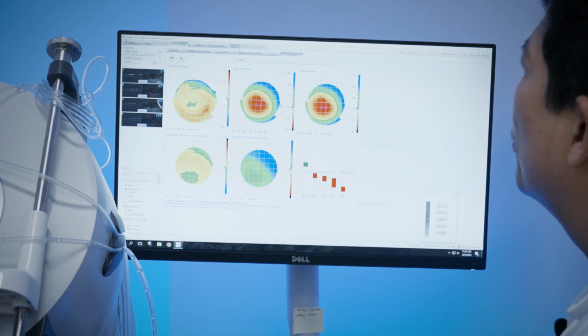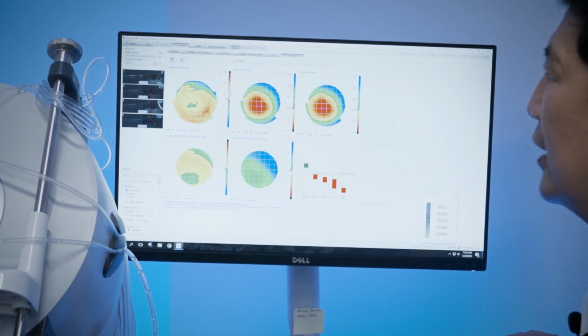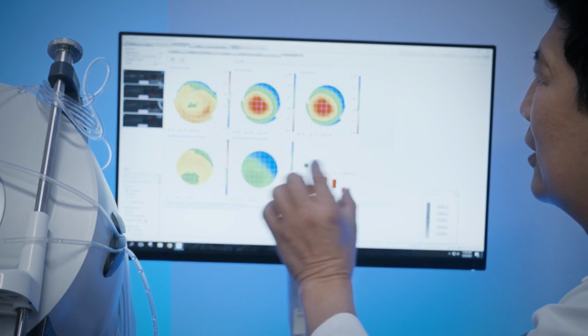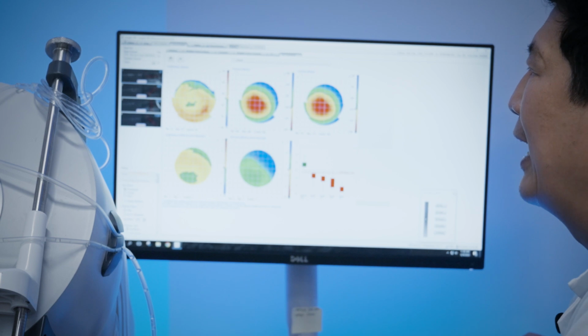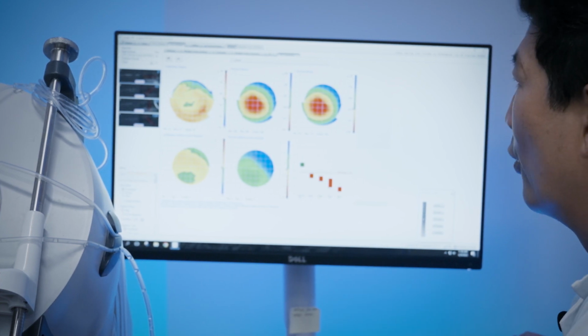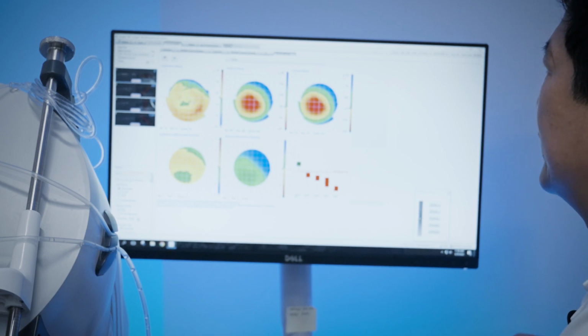These we don't usually look for. By the way, this is very useful also for post-operative flap, like LASIK, so you can look at the previous flap thickness, so you can decide whether to relift the flap or to create a new flap that's thinner, or to do PRK. If there's scars, it's very useful to look at all this information.